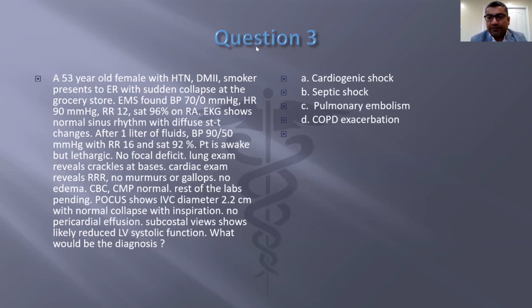However, EPSS can be falsely normal in a patient with stress-induced cardiomyopathy, because your base portion and up to mid portion would be normal or hypercontractile versus the apex, which is completely not seen, and you will miss the low EF. With short axis mid cavity view, you usually don't miss that.